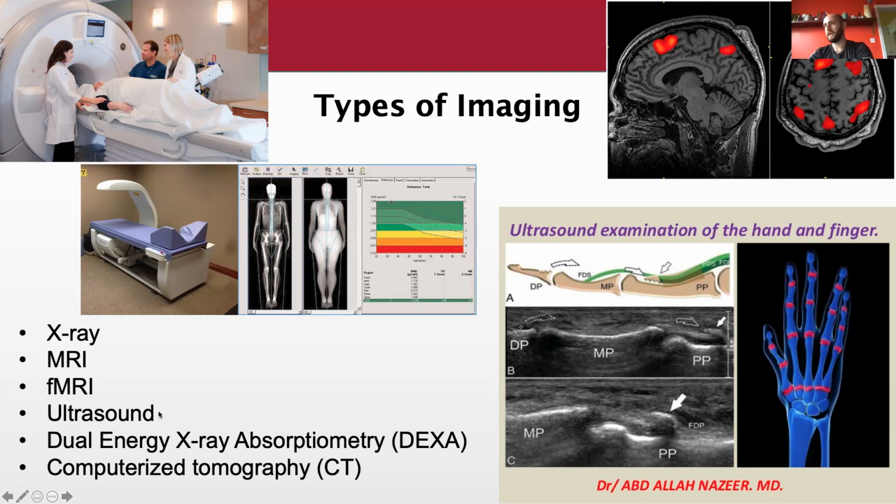So we have ultrasound here. Not just looking at babies in the womb now, we have been using ultrasound in certain clinics to look at soft tissue injuries. Here you have a little proximal phalangeal fracture, and this is to orient you. This is superficial, this is where the ultrasound head would be, and it projects an image down using sound that will recoil back up, and that's how we get our image.